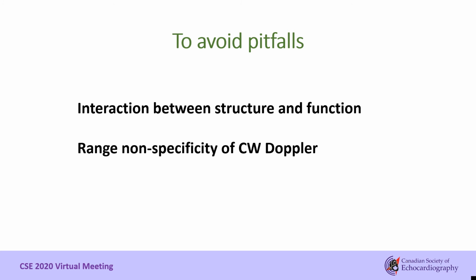This case underscored the important connection between structure and function. When the valve appears to open well, it would be inappropriate to believe that it is stenotic based on the Doppler signal by itself. A more common scenario actually is a highly sclerotic immobile aortic valve and low transvalvular velocity. In that case, it also would be inappropriate to conclude that this represents mild aortic stenosis without further testing.